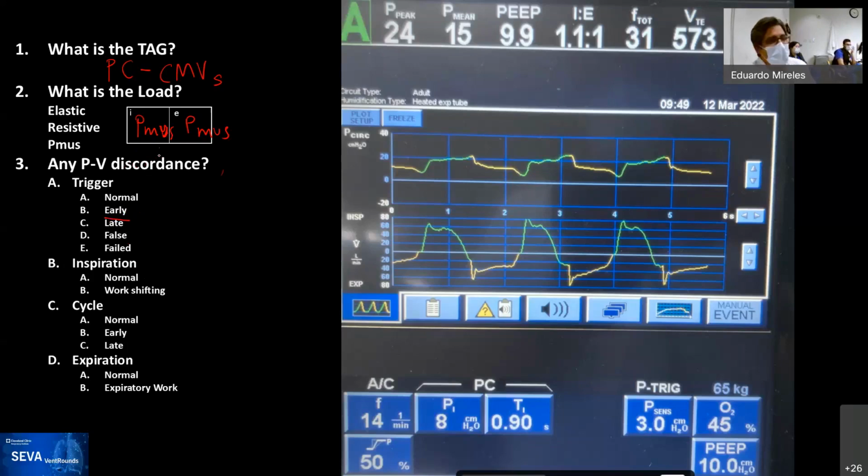But that's how I see it. I mean, there's a pressure trigger, and I don't see a color change. This one doesn't color change. No, it changes. It puts here either a C, that's controlled, or an A, which means assisted. It means that the patient triggered, and if it's assisted, so I mean it's triggered. So I'll take that back. Okay, so he recants.